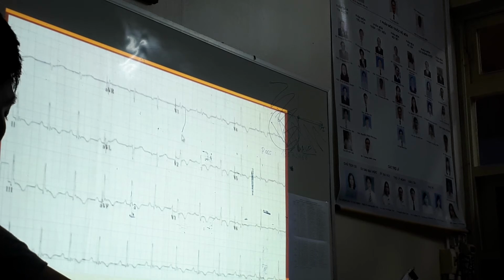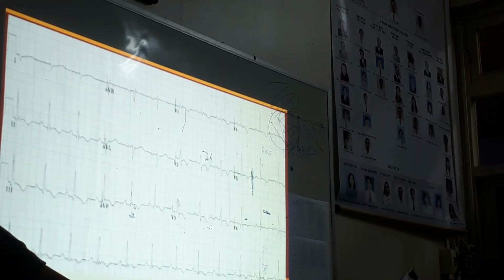So sometimes with ST segment elevation you're worried about heart attack, but in a young patient, not that likely. They have ST elevation sometimes, but they also have a notch here, and that's a way you know, oh, it's probably not ST elevation MI, but probably just benign early repolarization.